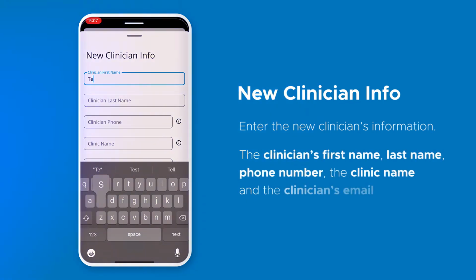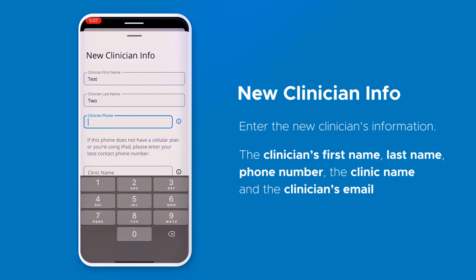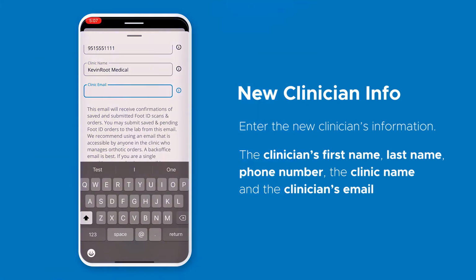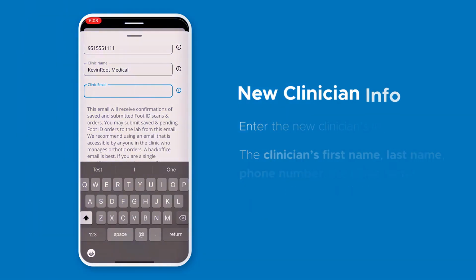The clinician's first name, last name, phone number, the clinic name, and the clinician's email.